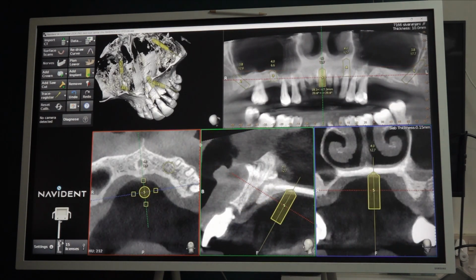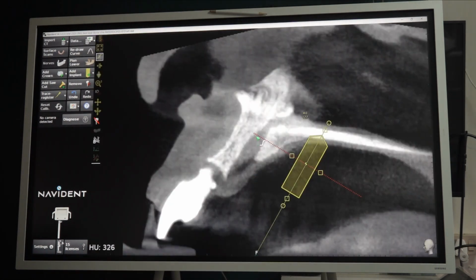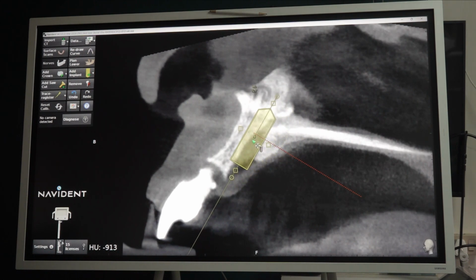So what we have to do is clear the contents of the canal and place a wide body implant. Okay, and you can see the vomer bone, septum area. You can place a longer implant, right? We have to remove the contents also. We have to clear the contents. Usually we do, no? In all cases we do.